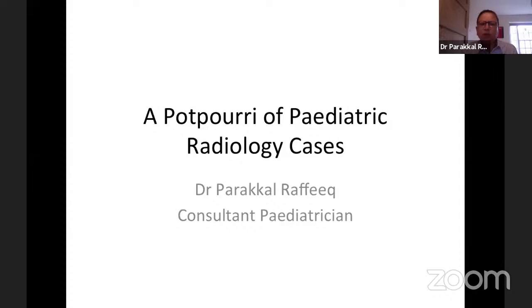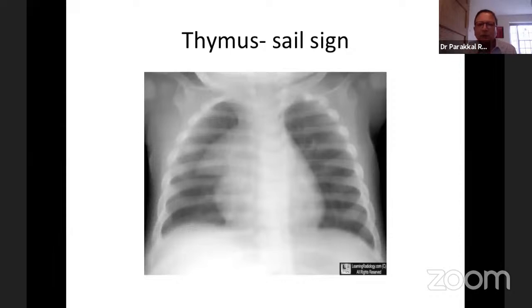One of the common ones we see is when one of the juniors has a look at this X-ray, and somebody posted earlier, how do we look at mediastinal widening in pediatrics? One thing in pediatrics is the age of the child that you need to consider. If this is a young child, we know the thymus is prominent at this age, and so mediastinal widening is usually bilateral. In this case you have sharp borders, which is otherwise called a sail sign, and it is common when the thymus is still quite large in young children. This can occur on both sides.